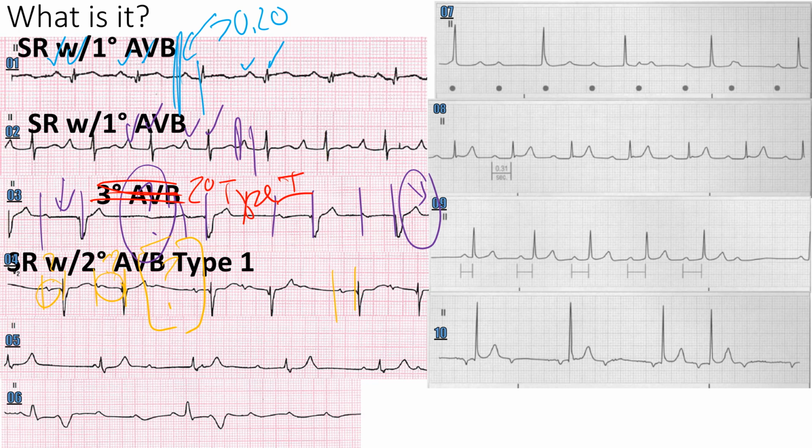And then what about number 5? So you got P wave QRS, you got P wave nothing. What is going on? Why is a P wave after the QRS segment? Are they associated or disassociated? They're disassociated. Also, if I measure this PR interval right here, that is ridiculous, right? That is 1, 2, 3 boxes at least, right? That's 0.60 at least. That is a ridiculous PR interval. If I have a ridiculous PR interval, automatically I'm thinking third degree, and I'm going to confirm that by saying, yep, that P wave is not where it should be. It's inside of the ST segment, right? So you can also see it added positivity to that T wave. It was right there on that T wave as well. All right, so that is a what kind of block? Third degree AV block.